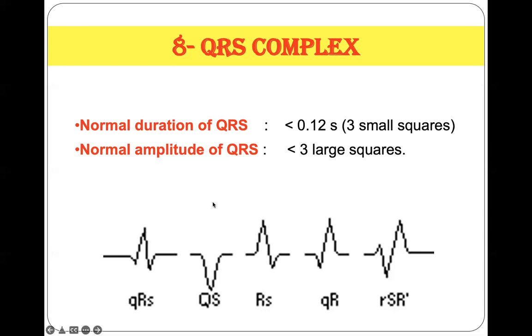Okay. QRS complex is formed of 3 parts: Q, R, and S waves. In order to identify these parts very easily, please follow the following concept. The QRS follows the P wave. The first negative wave following the P wave is the Q wave.